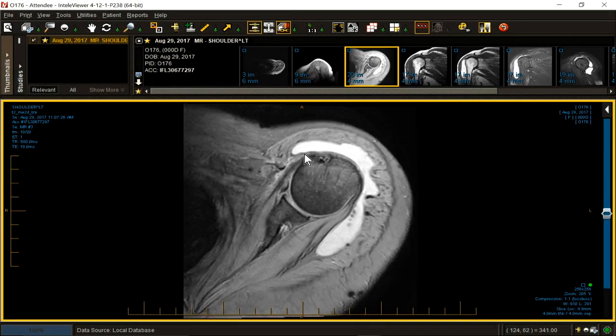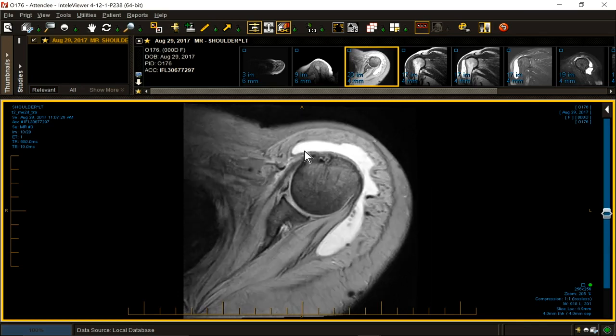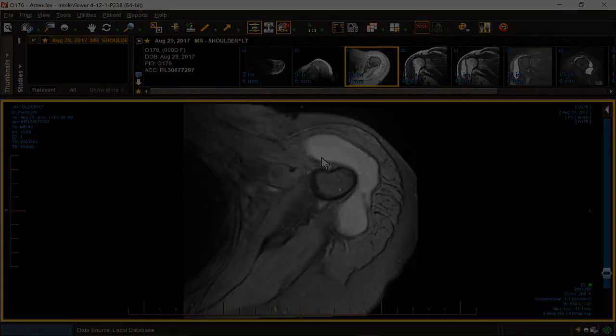I put up my first axial. It came off of a Siemens 1.5 short bore. I happen to know that machine because, with its shorter bore, it has lower contrast resolution than standard 1.5 Tesla machines. So I've already started to adjust my internal sensitivity.